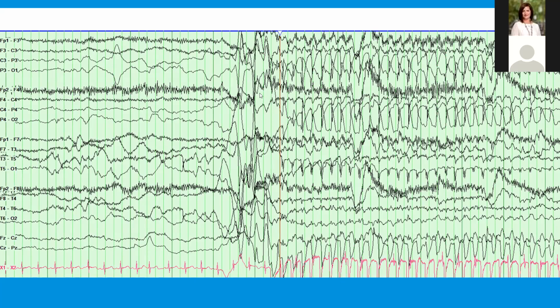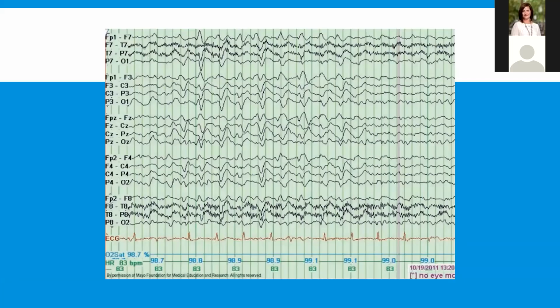All right, great. So let's go back to the triphasic waves because Sylvia had a question. Triphasic waves are actually on a spectrum. If they're slow, about 1 or 2 hertz, we don't treat triphasic waves. But if the triphasic waves start looking like generalized sharp waves, if they look epileptic, then we would treat them. Triphasic waves are a very advanced topic, and I didn't want to go into too much detail.